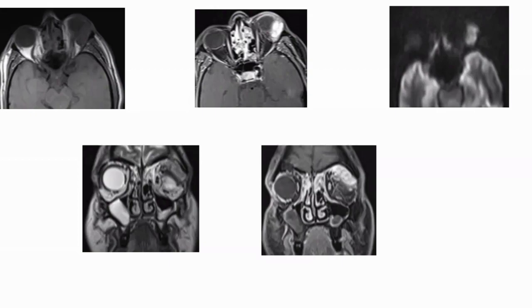These two. Yeah, so correct. It turned out to be carcinoma ex pleomorphic adenoma. So you are correct that this is likely a malignancy or neoplasm.